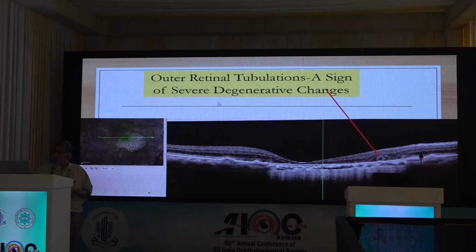What about this? Here you see fovea is thinned out. But you see this round cartwheel thing, it looks like a cyst. It's not a cyst. This is cartwheel-like, it is thickened walls.